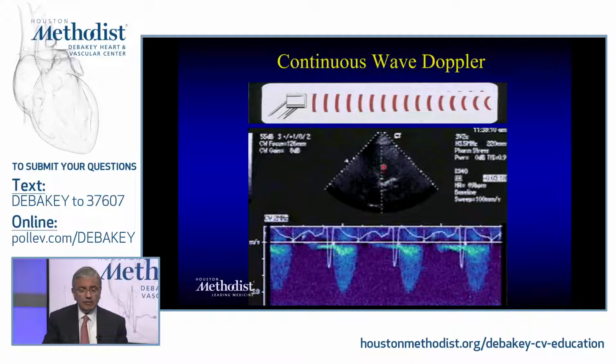However, if you had a stenosis here, and this was mild aortic stenosis, and if you had a dynamic stenosis here somewhere in the ventricle, the maximum would be that highest velocity. So remember, by CW, you are interrogating all the velocities all across, and the highest would be wherever the highest velocity is all across it. And at times it could be a surprise for you.